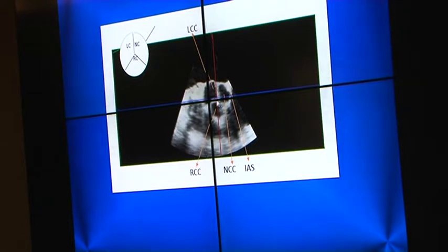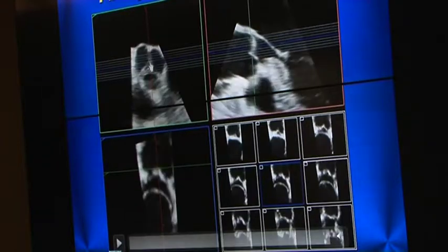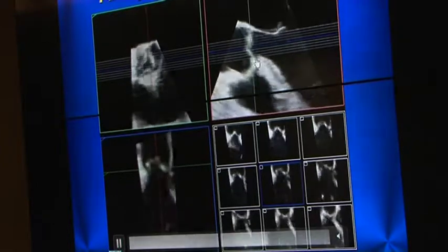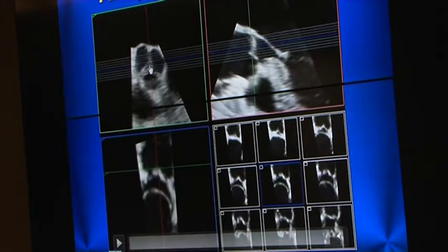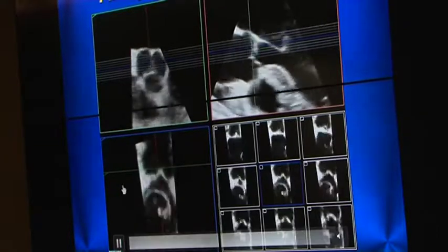So we can be 100% sure which cusp is which cusp, even in case of bicuspid aortic valve. And then what to do? We select one coaptation line, put the I-slice parallel cut planes, and analyze this coaptation from the central portion to the commissural point. Here are the corresponding images.